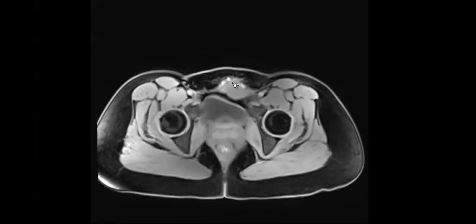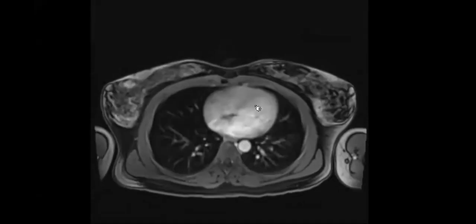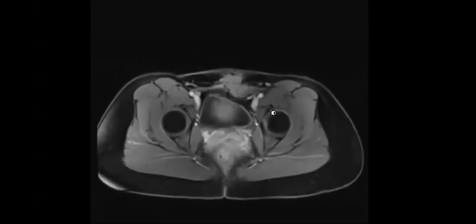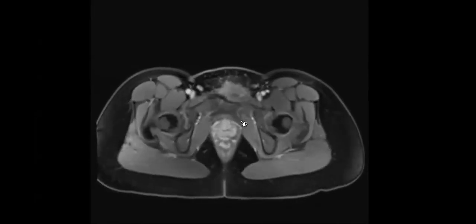This fibrotic part, one thing to note about this is that it's going to enhance. Typically, if we have an endometrioma in the ovary, we don't like enhancement. We think about malignant degeneration. But when you have a scar endometrioma, it causes a lot of fibrosis that can enhance. So don't be alarmed. That enhancement is not malignant degeneration. It's just a classic finding of a scar endometrioma.